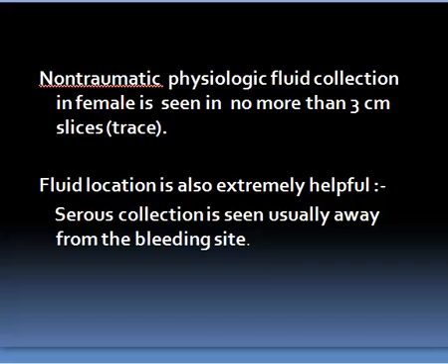Non-traumatic physiologic fluid collection in the female is seen in the pelvis no more than 3 slices. Fluid location is also extremely helpful. Serous fluid is seen usually away from the bleeding site. Serous fluid, not blood.